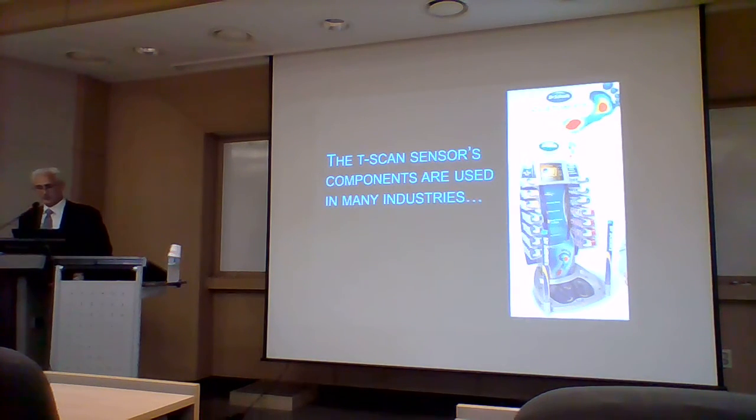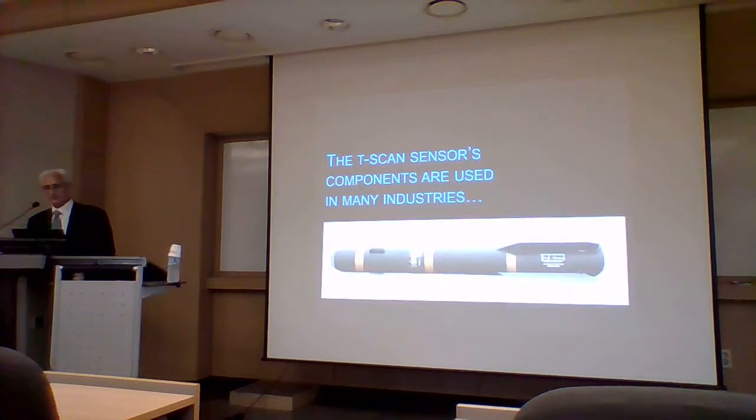So the T-scan sensor can be used in many shapes in industry. It's actually many applications. The first type that it was ever made was the T-scan bite sensor, but you can use it in foot analysis. See, the colors are the same, and the United States government actually uses them to surround nuclear warheads in trucks. So when they drive trucks around streets, like in Seoul, they don't hit a bump and blow up in the truck. So they're very powerful devices, the T-scan sensor.